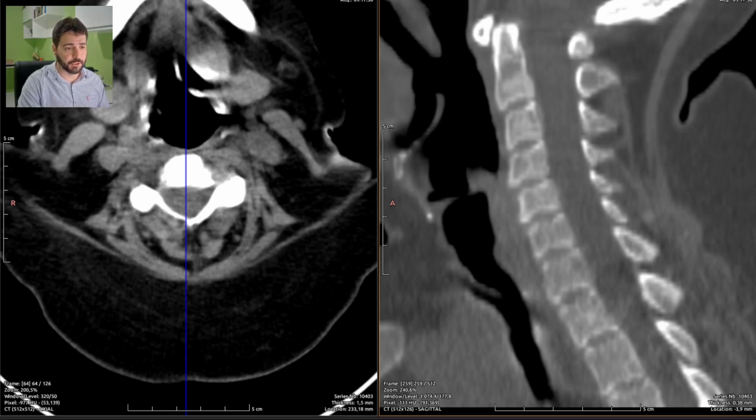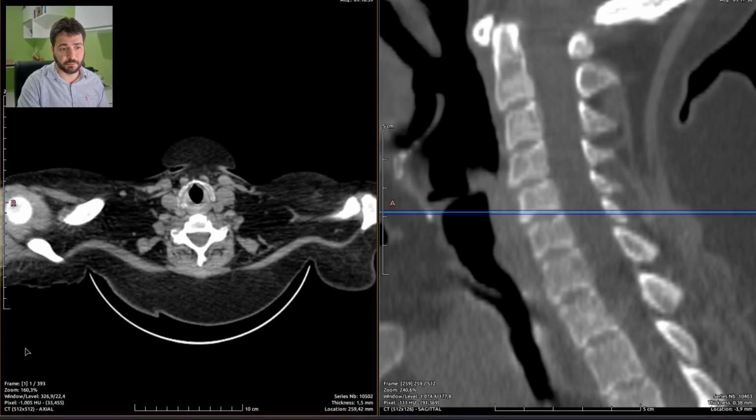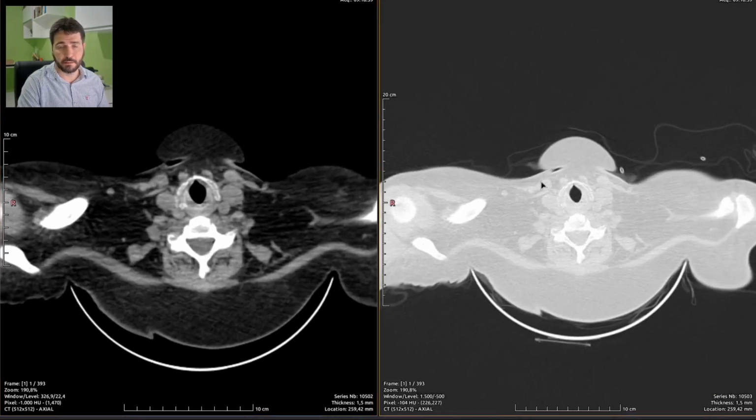The next one is the chest CT scan. So this is the mediastinal window and the lung window. Let's see, the chest entry here. This is an enhanced CT scan, all shaky and blurred, just like the rest of it. I have a template here for all CT scans of the chest. Of course, I'm not going to type the entire report every single time. I'm just going to change what matters.